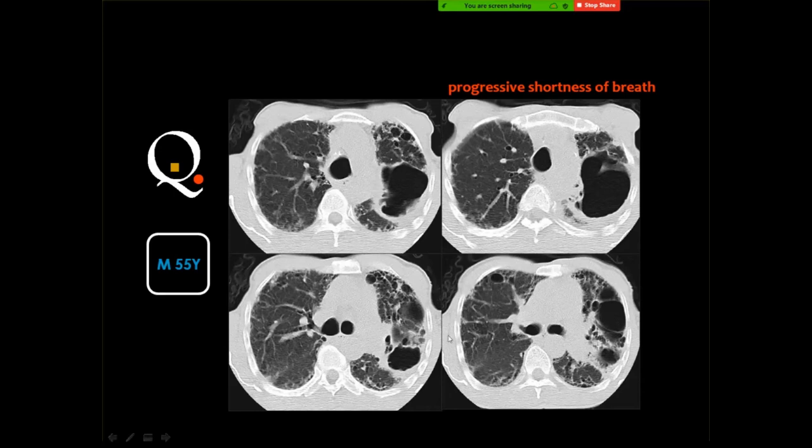What do you see? Is this a diffuse lung disease or focal? Yes, it's a diffuse lung disease. Which type? Interstitial, alveolar, miliary, cystic pattern? Interstitial with cavitation. Yes, this is interstitial disease with cavitations, and these cavitations are nothing but cystic bronchiectatic changes.